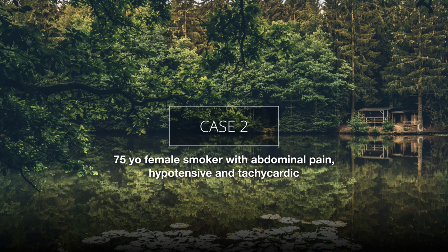Now, let's move on to the second case. So this second case that we're going to look at is a 75-year-old female.